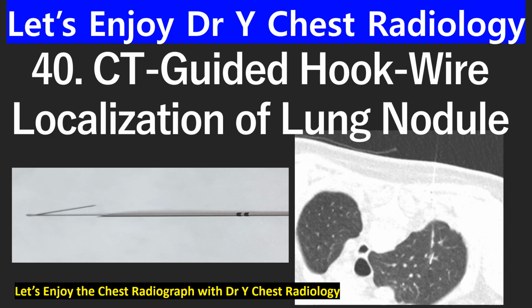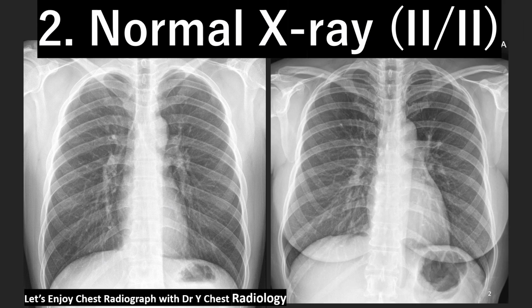Let's go. How do you feel about watching these two films? On the left side, young man, healthy, without abnormal findings. On the right-hand side, young woman, healthy, normal, without abnormal findings.